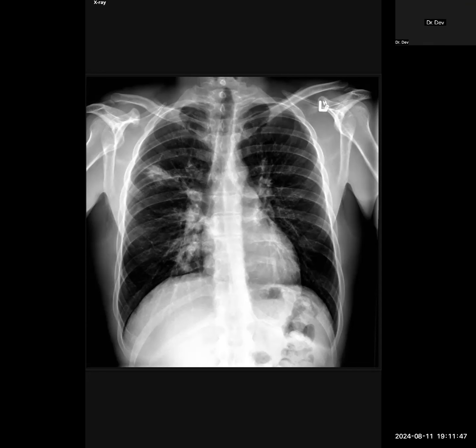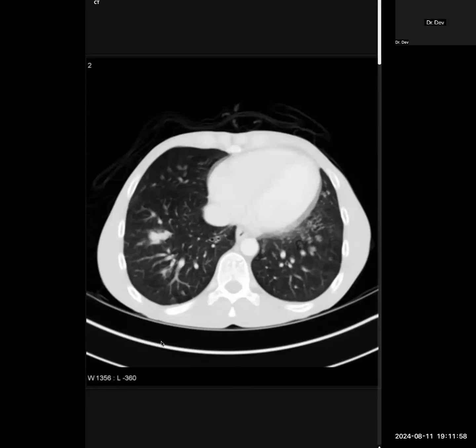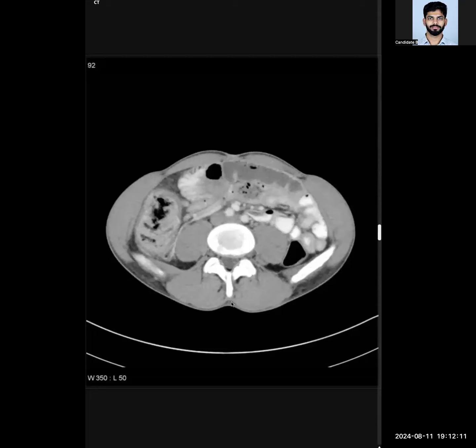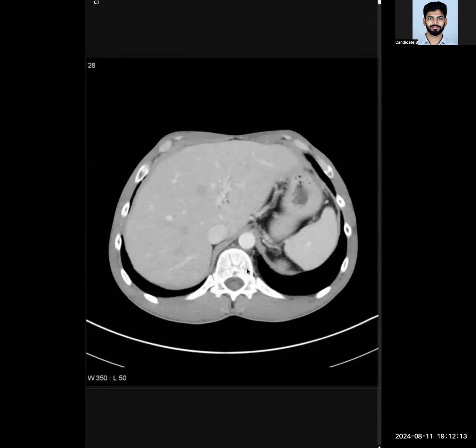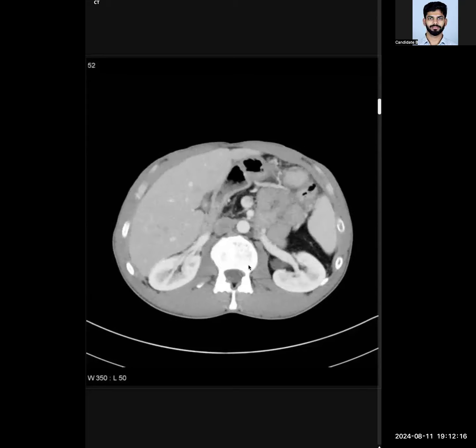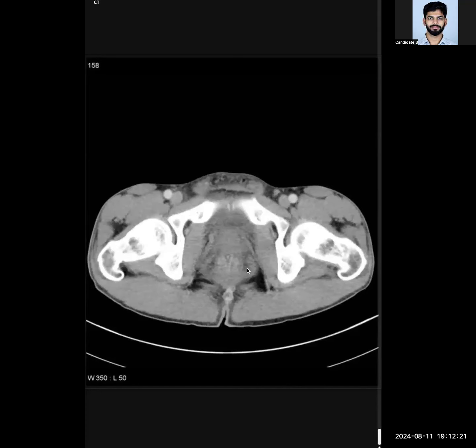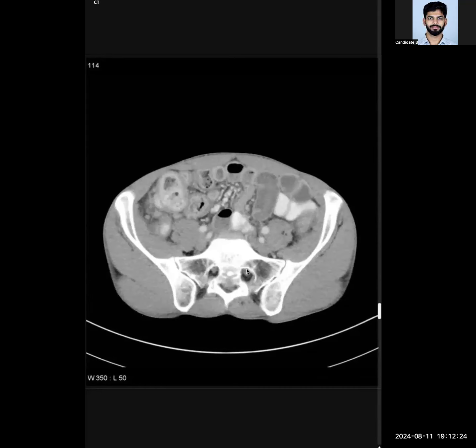So this patient, you find out after a call with the physician, is also presenting with abdominal distension and vomiting. So I'm giving you the CT for the same patient. You can ask for control and scroll. Provided are post-contrast axial sections of the abdomen and pelvis in the same patient presenting with abdominal distension. I'm going through the images from top to bottom.